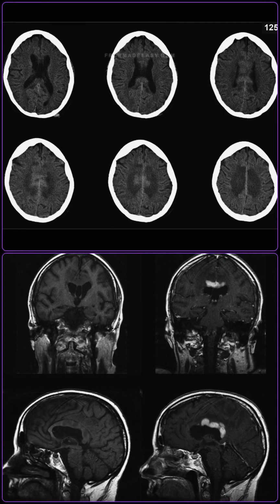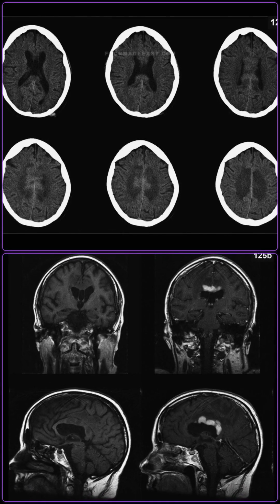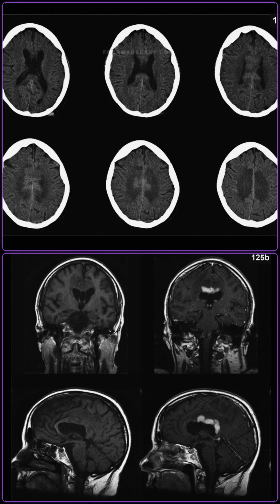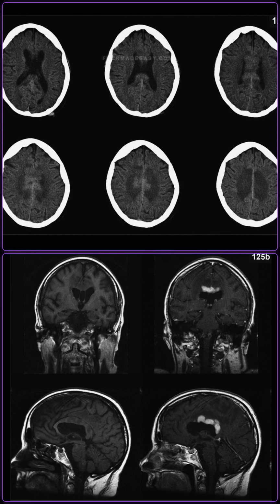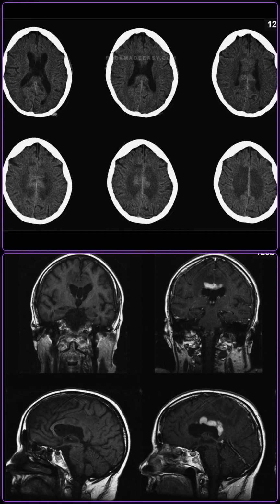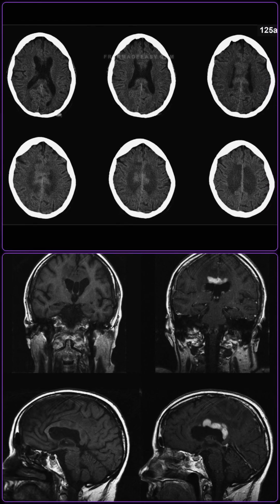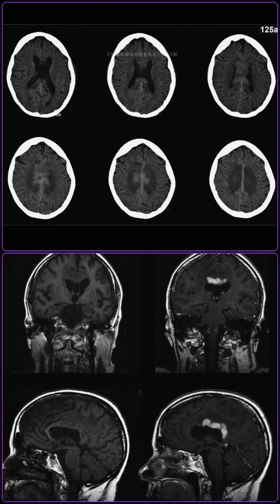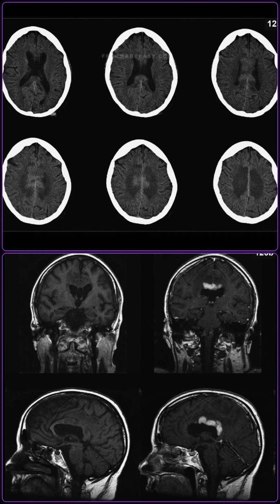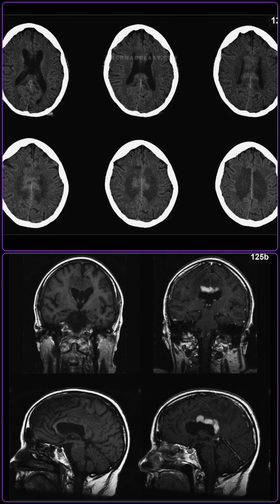Explain how to radiologically differentiate glioblastoma from primary CNS lymphoma and demyelination in the corpus callosum. Well, glioblastoma typically demonstrates heterogeneous or ring enhancement with central necrotic or cystic changes in about 95% of cases, although callosal lesions can enhance uniformly. Primary CNS lymphoma is typically hypercellular, appearing hyperdense on CT and T2 hypointense on MRI, and enhances uniformly without cavitation or necrosis, except in immunocompromised patients.